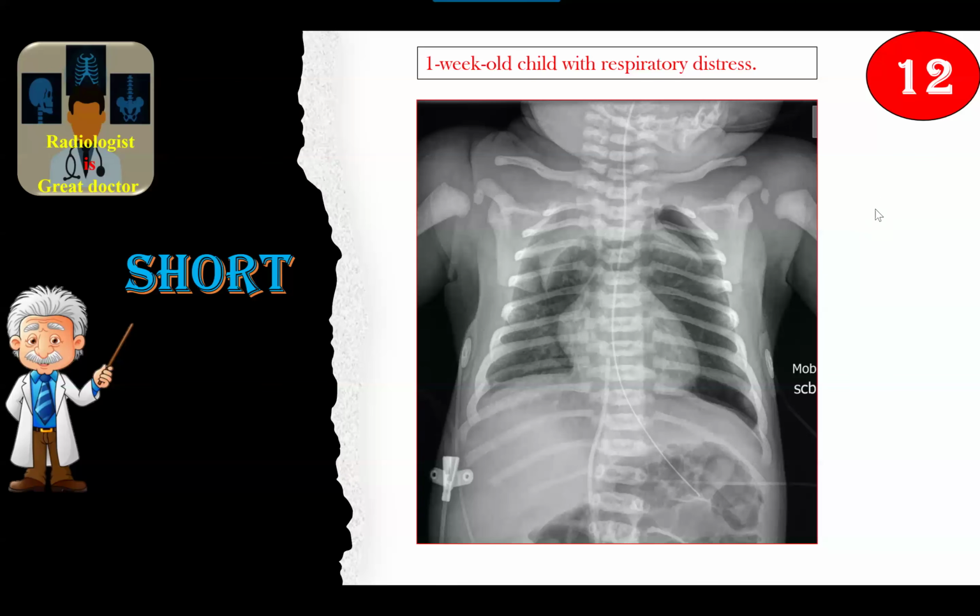Like this case, chest radiograph. A frontal chest radiograph of a child shows left-sided pneumothorax with underlying lung collapse. However, no significant mediastinal shift is seen. Air is also seen outlining the thymus, giving the sail sign, raising suspicion of pneumomediastinum as well. The right chest appears to be unremarkable. Heart size is normal. This patient needs immediate attention to lines and tubes.